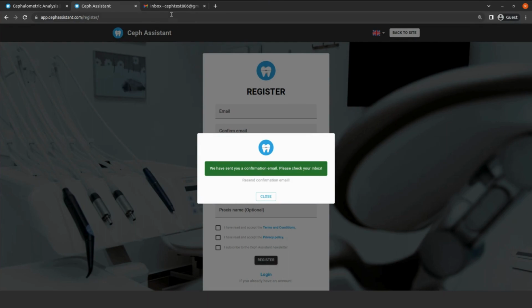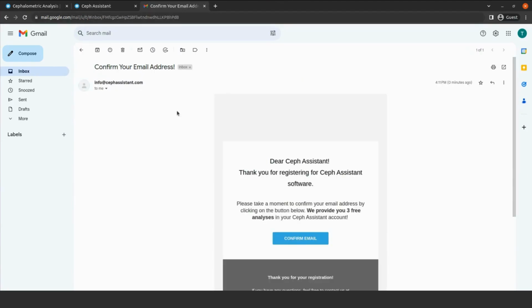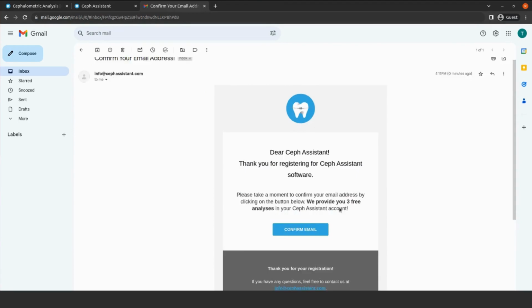Check your inbox. We have sent you a confirmation email. Please be patient. It can take around 10 seconds. There it is. Open your email and click on the confirmation button. And that was it.